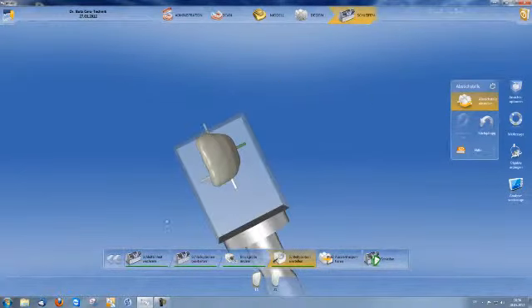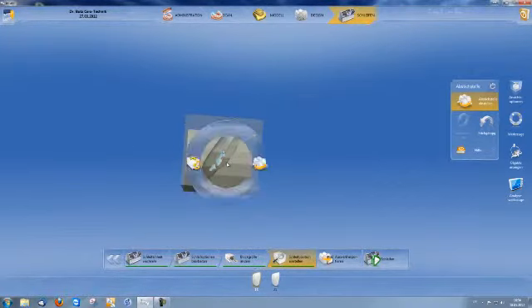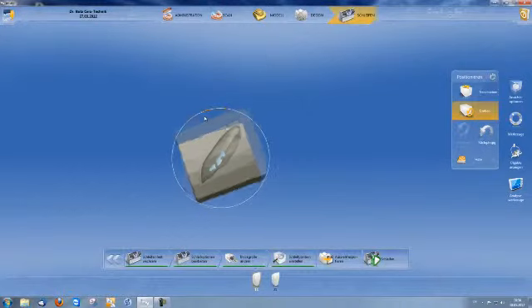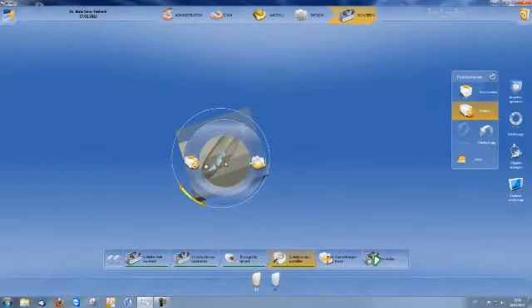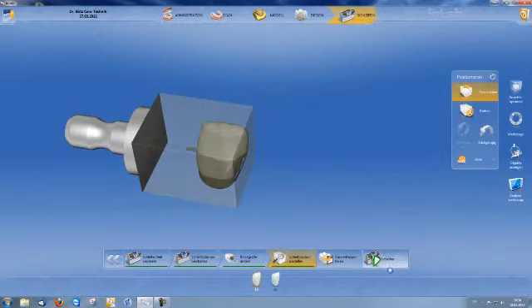If I place the sprue location mesially, I can rotate the veneer in the block via Block Rotate Position in order to change the various shades of my restoration, and via Position, I can render the veneer either more translucent or more opaque. In the final step, I give the mill command and can mill my veneer.